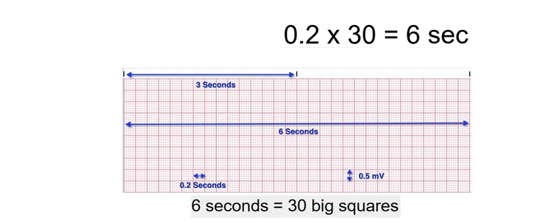In the exam, I know in UWorld it will not give it to you, but in some institutions where you work, they have a little marker on top of your EKG, which makes your life so much easier. I guess in the exam they won't make your life easier, but you need to know those things.